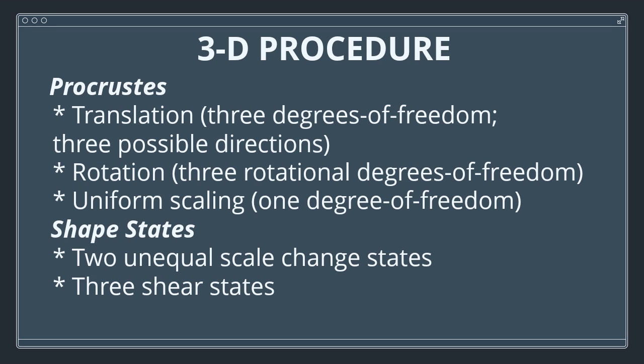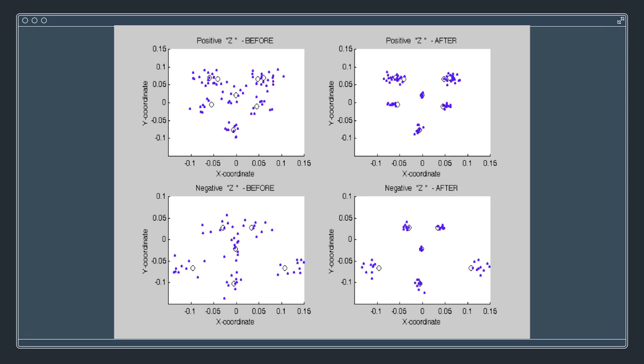You've already seen the 3D images, so all we need now are the before and after views for planar projections of those 3D images as seen from the top, front, and side. Projecting can cause some clusters to appear overlapped, for example from front and back, or top and bottom, or left and right. So I divided the 14 landmark clusters to get around that. It can't be prevented completely, but at least it can be minimized. The split is roughly 50-50. It doesn't have to be even, as long as the number of clusters matches the number of landmarks, and the number of dots in each cluster matches the number of patients.